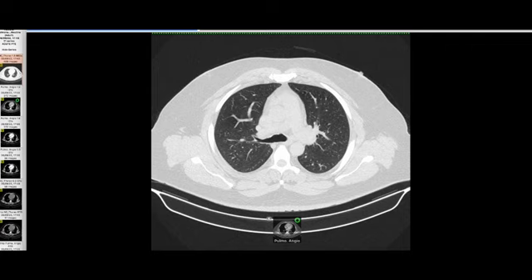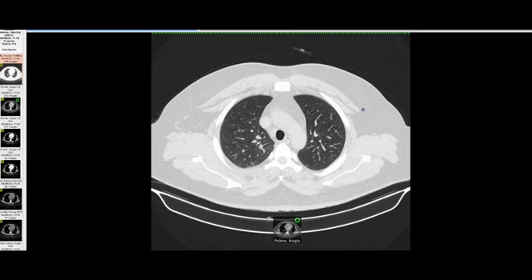Either there will be mosaic perfusion, which refers to alternate brighter and darker areas with a geographical margin in between. That is not seen in this case, I am just explaining. The hypodense areas are hypoperfused areas, and the caliber and the number of vessels in the darker areas will be lesser as compared to that in the brighter areas. That is mosaic perfusion, one pulmonary sign.